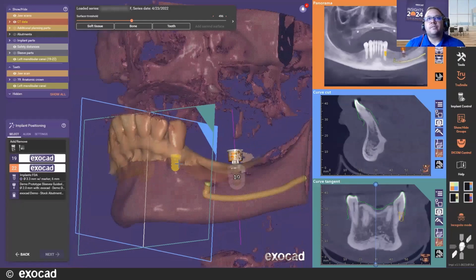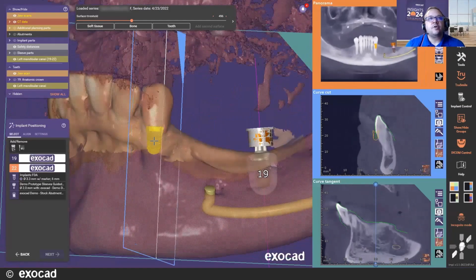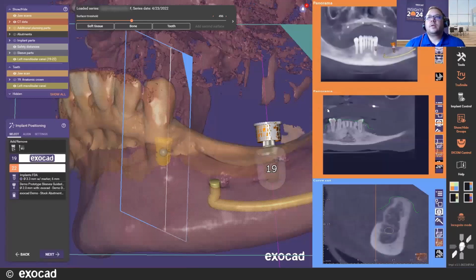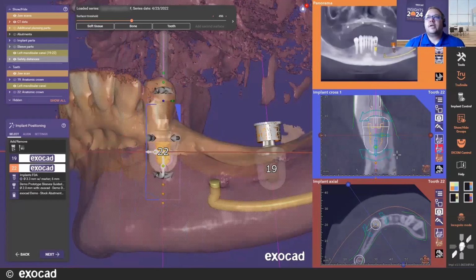And then once again, I like to just click in my mouse wheel button in the general area where I'm placing an implant, and then it centers my secondary views based off of that mouse wheel click. So we can just left click in position there, rotate accordingly, maybe adjust some length.